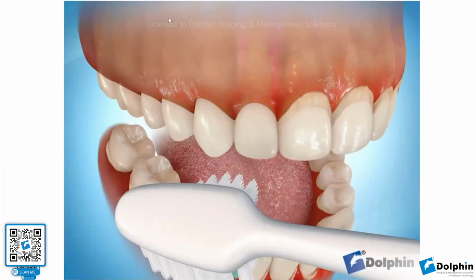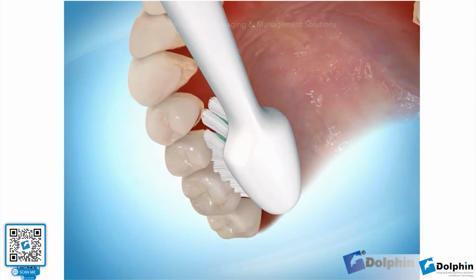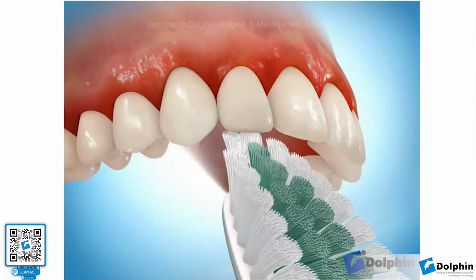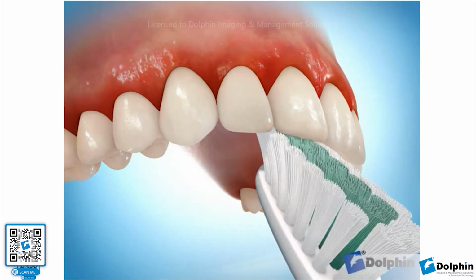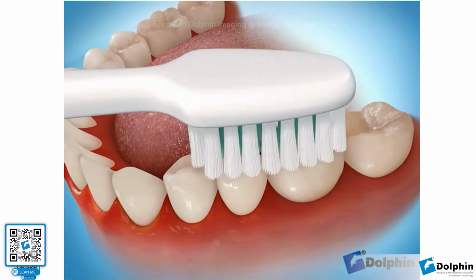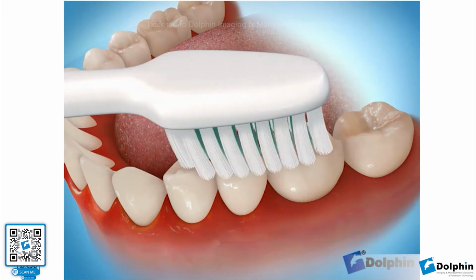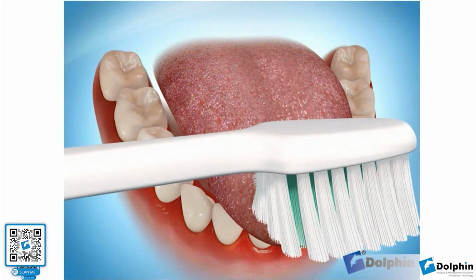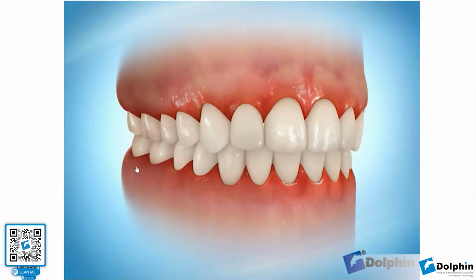Now let's go ahead and maximize the screen here so we see the full video. Now you can see the quality of our Aquarium videos is very nice, 3D view, and a patient can really understand what they're going to be going through in treatment or how to properly brush their teeth and so on. Now, basically, we're really educating the patient. Let's go over some of the tools that are provided here while the video is playing.